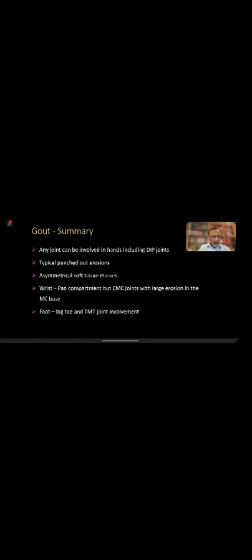Yeah, it's a very good question. Ramika asked this question. Bone density in acute gout is preserved, but when it's chronic gout, because patients start to have disuse, then bone density is reduced. So in acute gout, it is preserved.